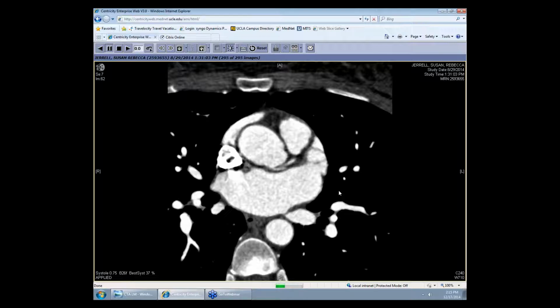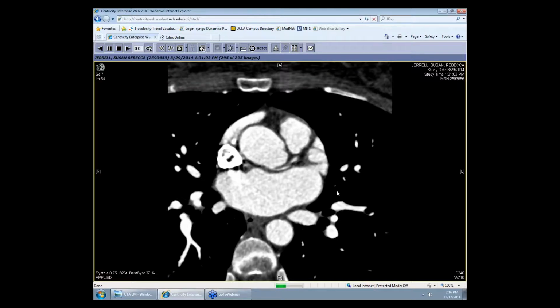So, Paulo, this is the case that my colleague, Dr. Aksoy, talked to you about. I think we sent you the images. You see, in cross-section, it looks like the left main is small, but it comes off the left sinus of Valsalva, posteriorly next to the non-coronary sinus, and at an angle, but it's not intramural. You see the bifurcation of the left main is seen there, or you can suggest it. You see that? Just go back.